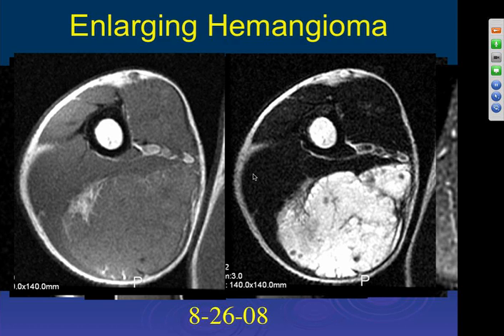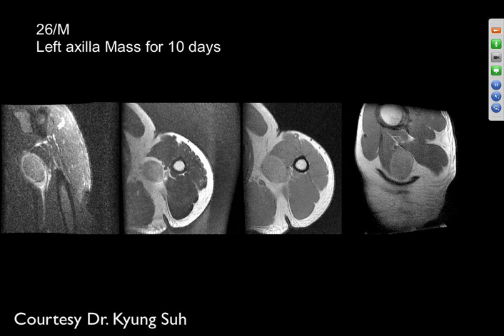Is it enlarging? This hemangioma is actually enlarging, so these can enlarge over time. You can see multiple phleboliths in them. Again, remember, we're using the generic term hemangioma here rather than the specific term. This would be more of a low-flow malformation. All righty. Brian.